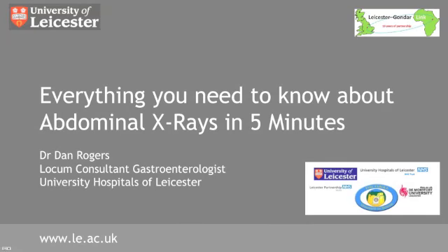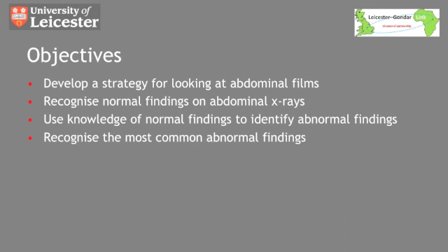My name's Dan Rogers. I'm a consultant gastroenterologist at the University Hospitals of Leicester. We're going to cover everything you need to know about abdominal x-rays in 5 minutes. Please pause the presentation at any point to look at the x-rays presented in more detail.